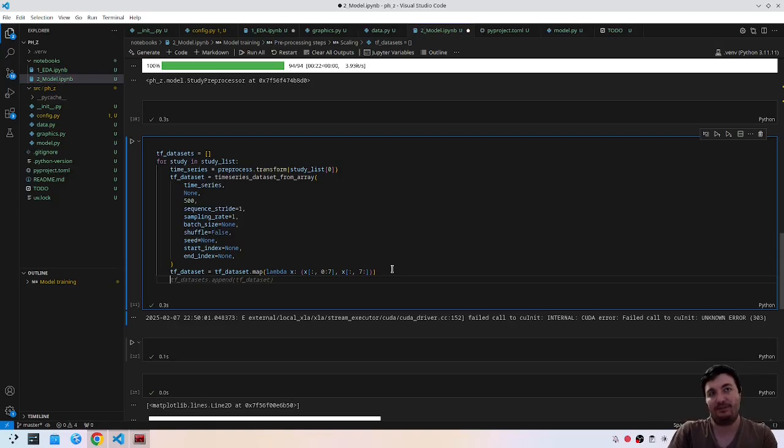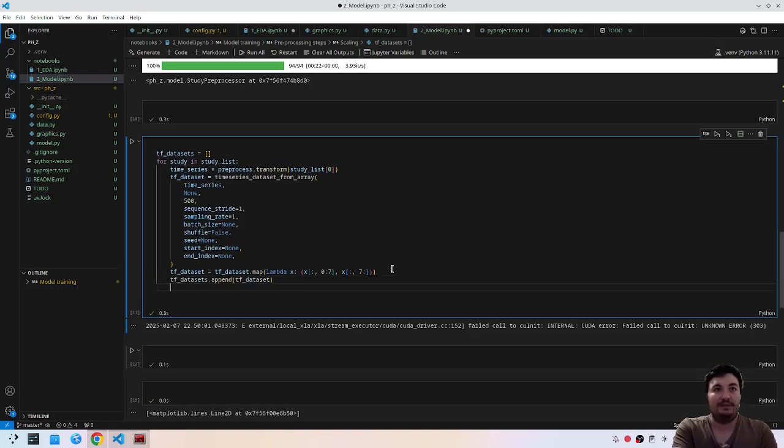This is just, I will want to receive a list of studies and return a Tensorflow dataset just ready for being fitted in the model. Then we can split it and call this function. I would like to create a tf.data.dataset. I can say something like this.